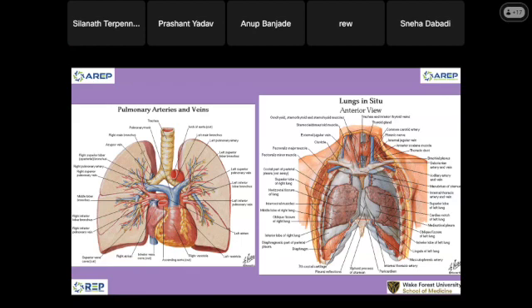This is the left ventricle, which forms the left heart shadow on chest radiograph. And this is our fissure that separates the upper lobe from the middle lobe and lower lobe. This one is the upper lobe, and this one would be the middle lobe. The middle lobe is here, and then this one is the lower lobe. We'll show you on CT tomorrow.